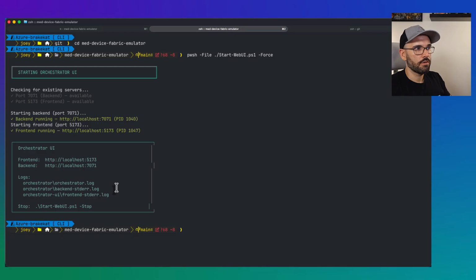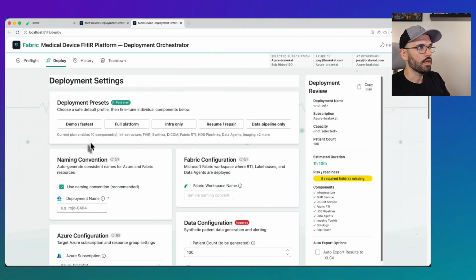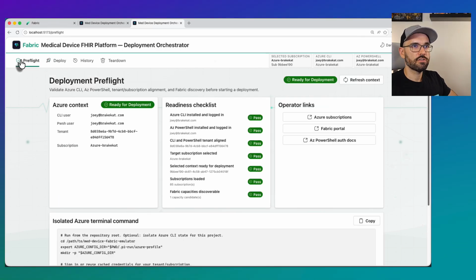And it's going to start up very quickly. If you see here, there is this localhost. If I hold down Control or Command, I can click on this link. So I'm going to click on that now. And here I am. A couple of things up front. First off, the pre-flight checks automatically happen. You don't have to do anything about it. But if you do have something that the scripts need, this tab will let you know what you need to do to install it. I'm not going to spend a lot of time here, that's another video, but I do want to mention that if you have any problems, click this here before you go into troubleshooting in FAQ mode.